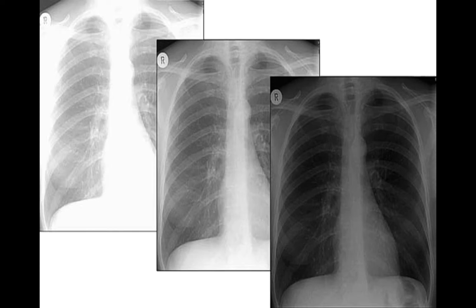So we shouldn't consider both of them as pathologies, because they're due to contrast settings or overexposure of radiation or X-ray, and the optimum one is this.